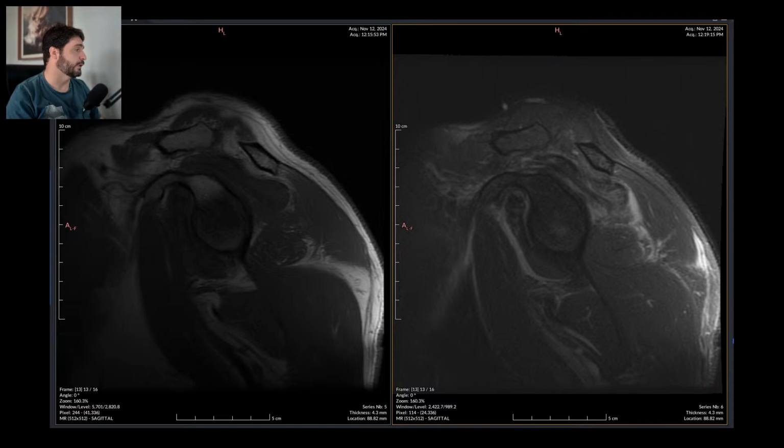Let's report it as much as we can. I have a template that says most of what I just told you guys, so I'm just going to improve it by adding stuff I just found out and described to you guys.